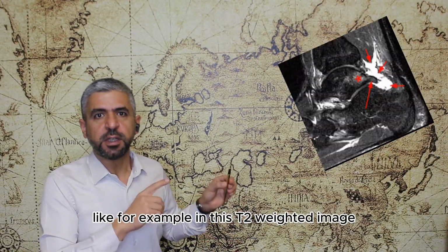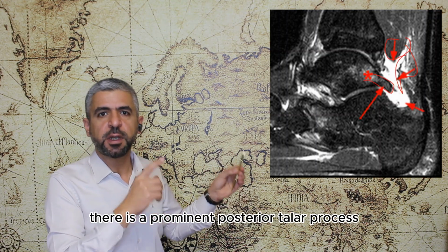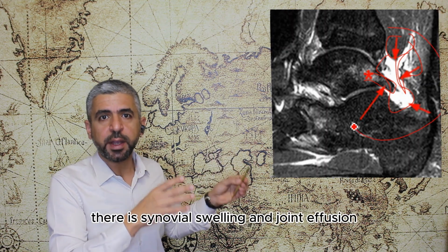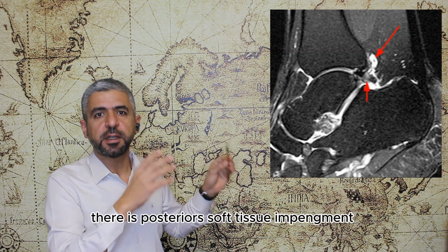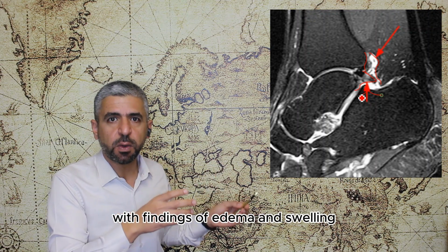Like for example, in this T2 weighted image, you can see there is prominent edema, there is a prominent posterior talar process, and you can see there is synovial swelling and joint effusion. Another example here, you can see posteriorly there is posterior soft tissue impingement with findings of edema and swelling and possible tenosynovitis.